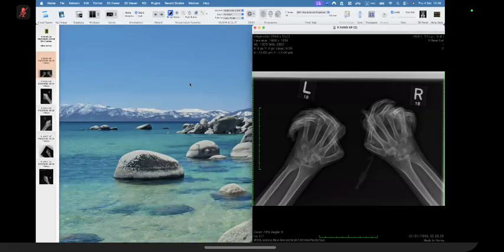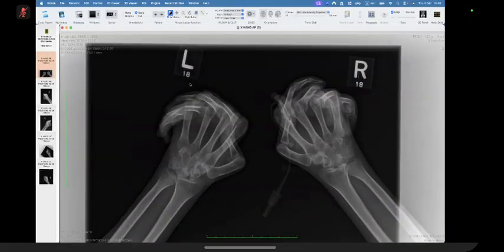Okay, let's come back to this case. Can you point out where the erosions are? I am not sure if I can take the... Try and take control if you can. Am I getting a request? No, I'm not getting a request. From where can I get the request? It usually is.